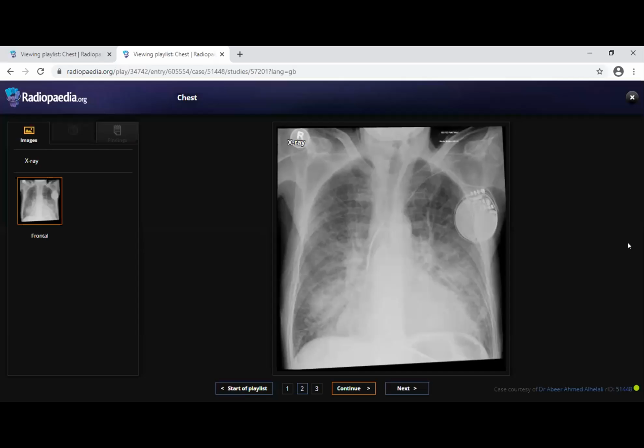So in summary, there is a finding of chronic heart failure. I would like to refer the patient to the referring physician and inform about the finding, and I'd like to compare with any previous image. I recommend to follow up the X-ray after heart treatment with diuretic treatment. Also, I recommend to do echocardiography. Okay, fine. We'll go to the next case.